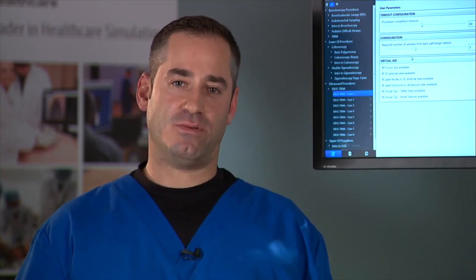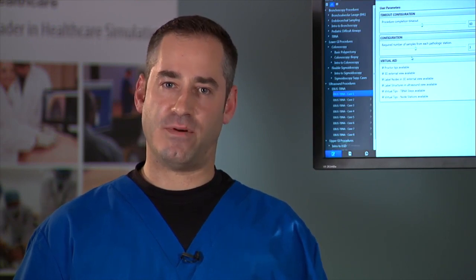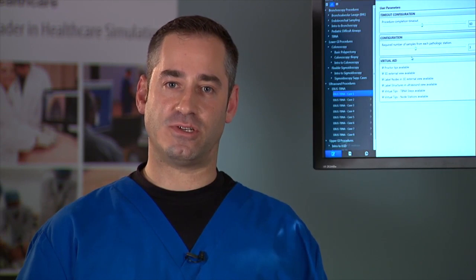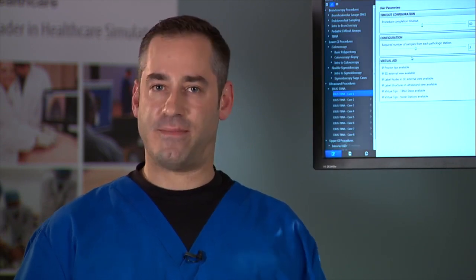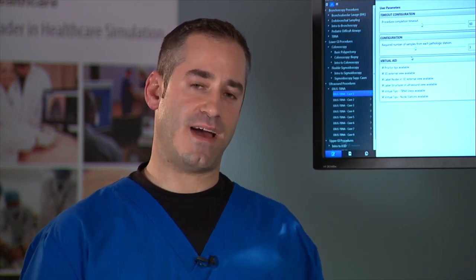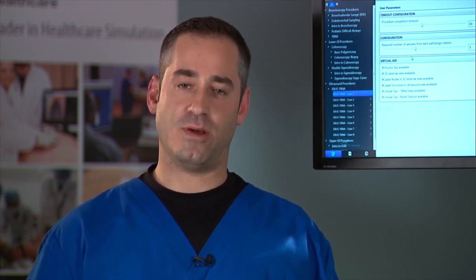Now that we've had a chance to review the different cases and pathologies within the EndoVR simulator for upper and lower GI as well as bronchoscopy, as well as the administration features within the EndoVR, let's recap. What would you say to your client the first time you speak to them? First, point out the fact that the system can be elevated or lowered to accommodate the operator's height. Don't short-sight this. This can be quite important to them.